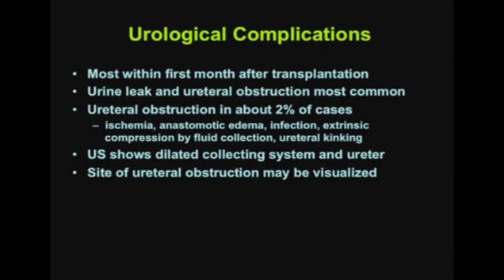Other causes include infection, extrinsic compression by a fluid collection, or kinking of the ureter. By ultrasound, one can see a dilated collecting system and a dilated ureter, and the site of ureteral obstruction may be visualized as well.